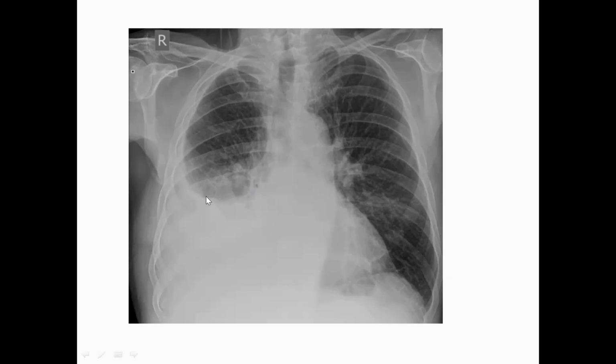When you spot that there's a pleural effusion, you have to look at other features to know the cause. If there is any consolidation or density, like in this case, the patient had this X-ray due to progressive shortness of breath. So this is a pleural effusion, you spot it out. Here there is an upper zone, with upper lobe vessels dominant in the upper zone. Do you look at here? There are dominant upper lobe vessels.